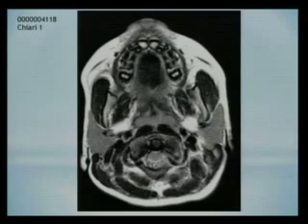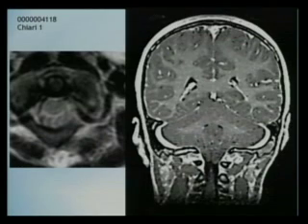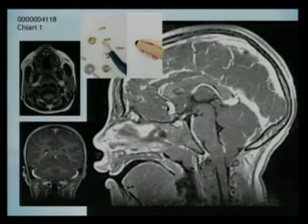So these are low-lying tonsils. It becomes more obvious on the coronals. See them like that here. And most obvious on the sagittal, where they protrude down here to the lower edge of the atlas.